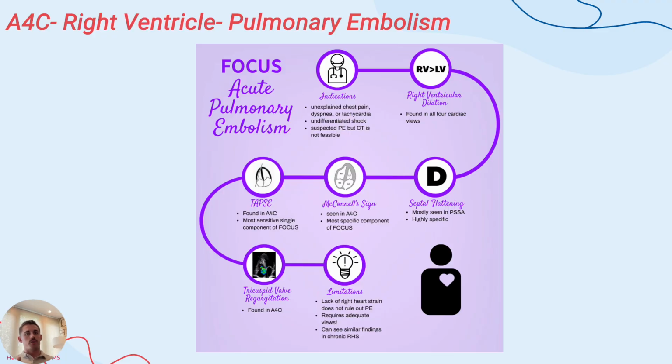Moving on, right ventricle is a great place to start talking about our PE diagnoses. I thought this was a really awesome way of looking at PE as an algorithmic evaluation of the patient as a whole, and then evaluating them with ultrasound.